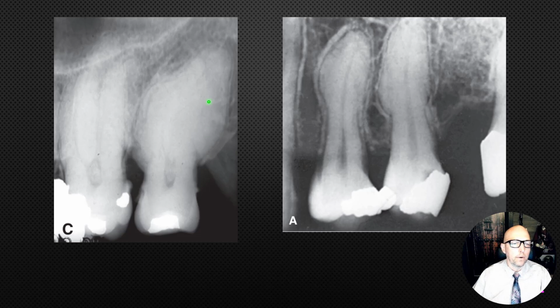So how can I distinguish this from idiopathic osteosclerosis? I would have a more normal looking root in idiopathic osteosclerosis. And where would the PDL space be? It would follow the outline of the root. In this case, the PDL space follows the outline of the hypercementosis. And notice that the PDL space is uniform in thickness. It's not widened. That will contrast it with all these other lesions we're talking about today.